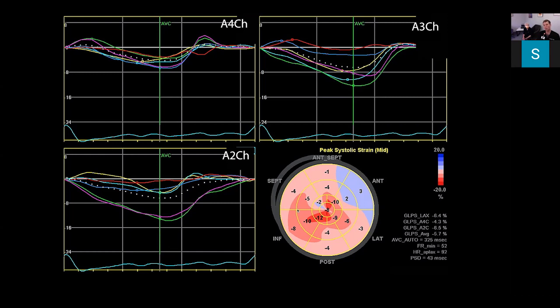What do you think, what pathology might give that? Okay, so the cherry on top is consistent with amyloid, but may not be amyloid. Could be another infiltrating disease. Could be ischemia. I guess it could be dual vessel ischemia with the right coronary involved, for example.